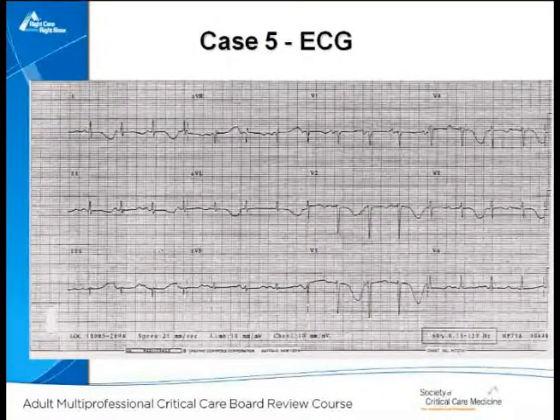Is that better? Okay. So we go through the history, alcoholic, intoxicated. In fact, if you look in the literature, the time this is most commonly described is in people with recurrent vomiting in the setting of alcoholic hepatitis. It's a mixed electrolyte problem. It's usually deficiencies of intracellular potassium, total body magnesium, and total body calcium. So you have to actually replete everything. The numbers themselves will usually be quite low, but when you see T-wave alternans, QT prolongation, the appropriate history, always think electrolyte repletion, and that's what most of the people did.